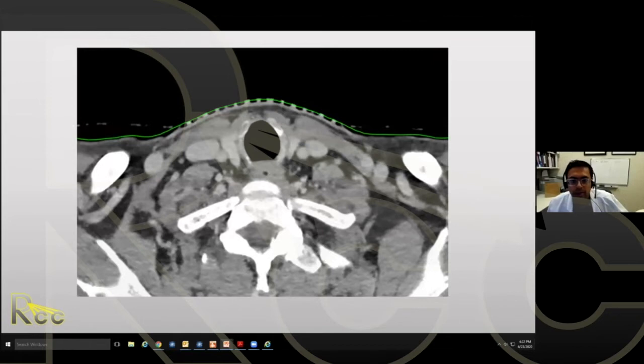All right. So what am I pointing at here? Yes, the esophagus. So why I point this out is because the cricoid cartilage is a completely encircled cartilage. And you notice that once you lose that posterior boundary and you see the esophagus bulging into the cartilage, you've reached the caudal edge of the cricoid.